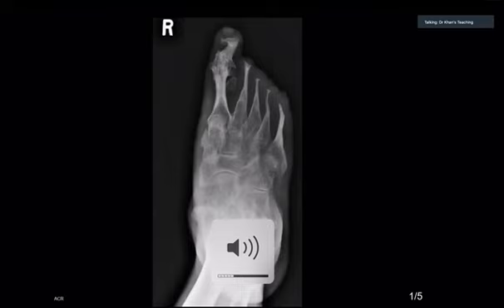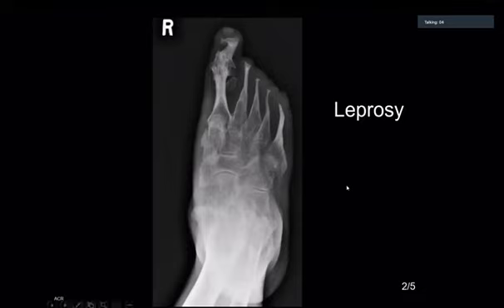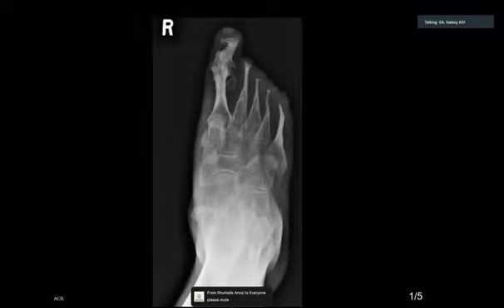This is a DP radiograph of the right foot of a skeletally mature patient. There is multifocal abnormality with absence of the bones distal to the metatarsophalangeal joint of the second to fifth rays, and those second to fifth metatarsals are tapered and diffusely sclerotic.